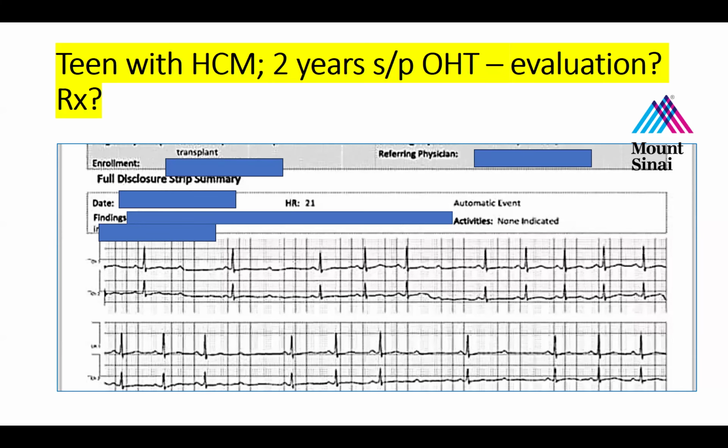You said the patient's been having near syncope? Intermittent near syncope episodes, and you have this tracing. So I wouldn't send the kid home, especially if they're symptomatic.